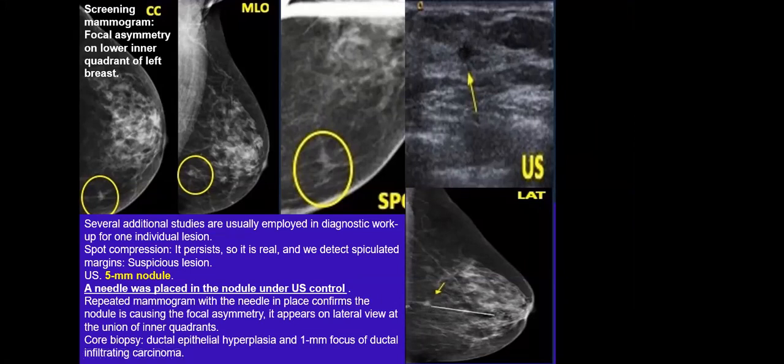It might be another area. To confirm the biopsy is taken from the corresponding asymmetry, and here the asymmetry from the mediolateral oblique to lateral view is just a little bit superior. Look, it is superior here. It is in the lower quadrant, and here going toward the central quadrant, a little bit higher because it is on the medial aspect.